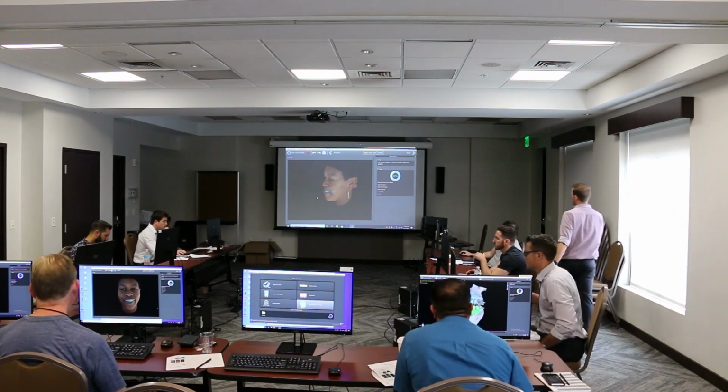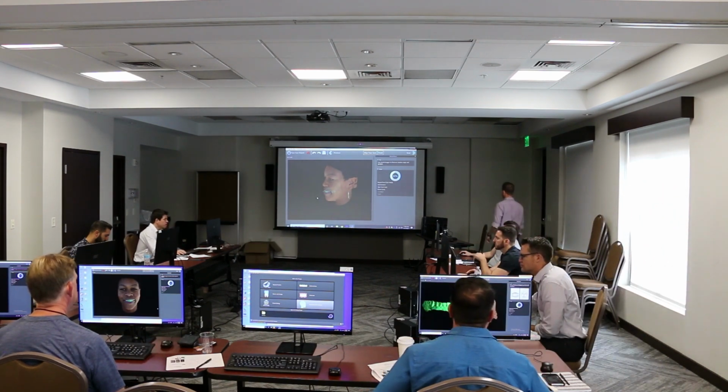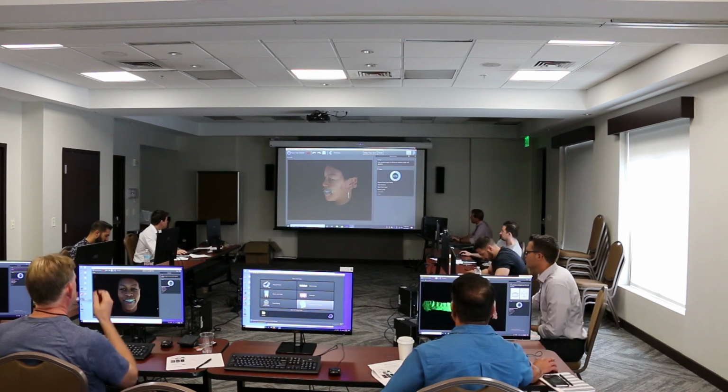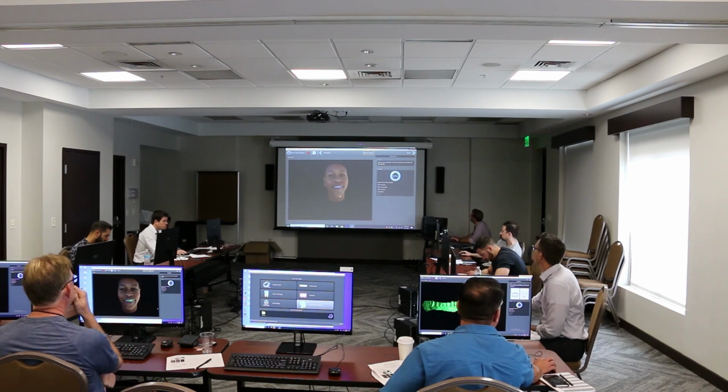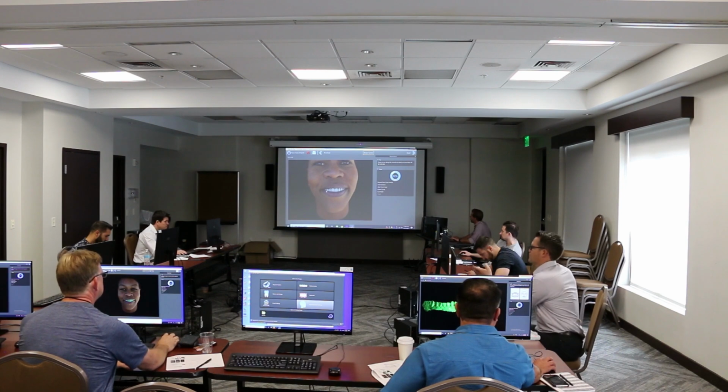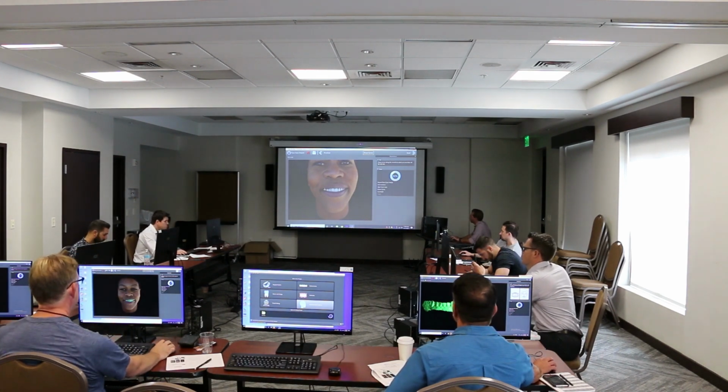So, you guys just get this thing close. Don't worry too much about the alignment right here, and let's just hit next. Because this is where we want to cut the lips out. So, this is where we're going to zoom in, and we're going to shift click our lip outline.